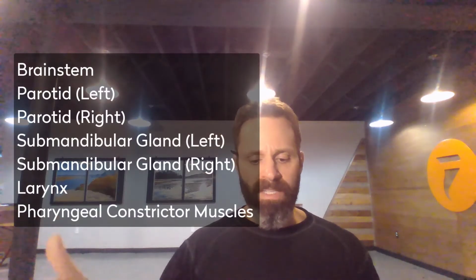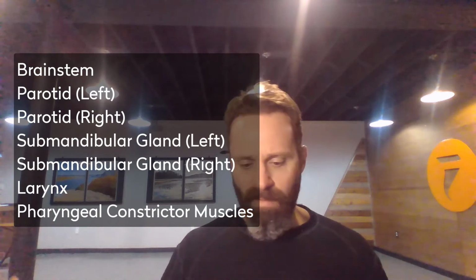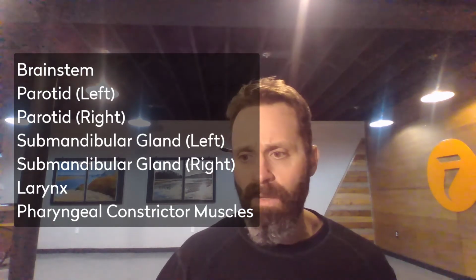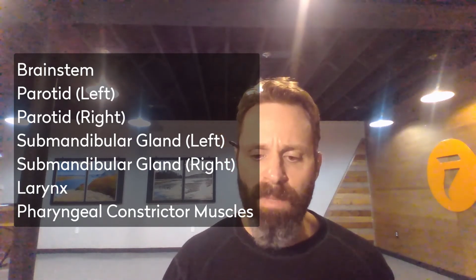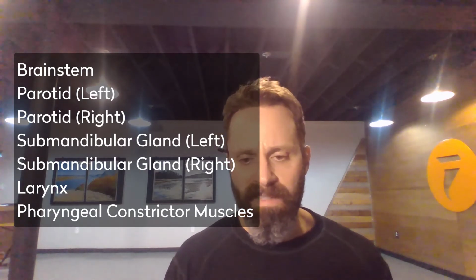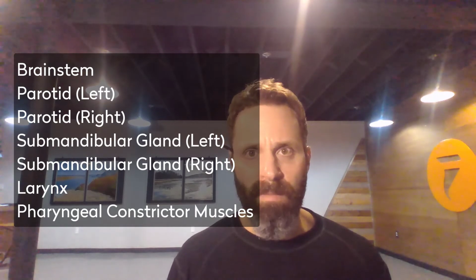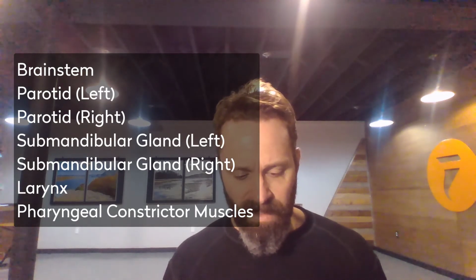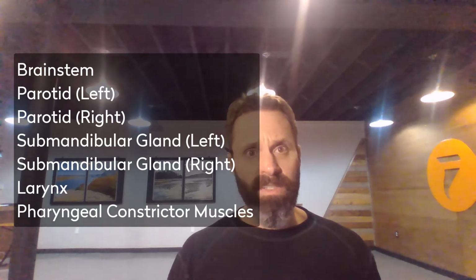And again, we're doing brainstem, left parotid, right parotid, left submandibular gland, right submandibular gland. I will say the right submandibular gland in this patient was in the invaded target region, so it will probably look different than the left one, which was the contralateral. Larynx and pharyngeal constrictor. So think about what you think is most and least variable and everything in between, and by the end of this meeting, we'll have some numbers to put on it. All right, so let's do it.